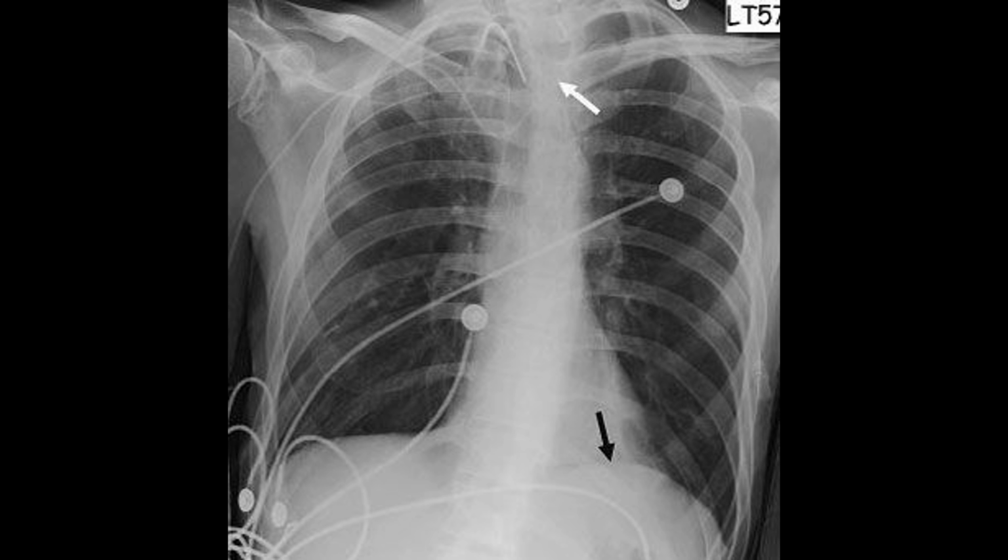The main differential diagnosis for this appearance is left lower lobe pneumonia versus collapse. However, the presence of significant volume loss, indicated by rib crowding, diaphragmatic elevation, and hilar displacement, strongly favors collapse. Left lower lobe collapse typically produces a retrocardiac triangular opacity, with the base of the triangle obscuring the left hemidiaphragm and the apex pointing toward the hilum.